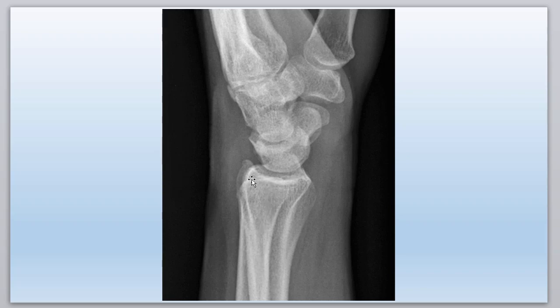And you can see this structure right here is the styloid process of the ulna. Now the styloid process of the radius is here. See how it's superimposed over a big bone here? It looks like a Pac-Man. See kind of the C here? That's the lunate bone. You can see the distal articular surface of the lunate here, which has to be lined up nicely with the capitate. So there's the capitate and the lunate. Looks a little funky on this one. Almost looks like there's another bone superimposed, but it's not.